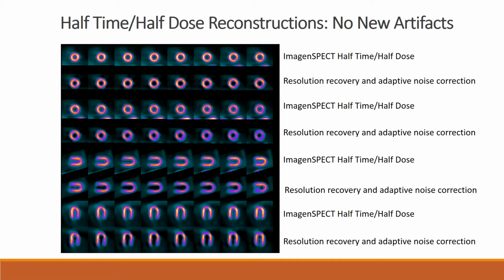There are several options available for nuclear cardiology laboratories that choose to use conventional SPECT imaging instrumentation. In this illustration, ImagenSPECT is compared with another workstation solution for performing half-time imaging in a uniform cardiac phantom. ImagenSPECT is optimized to provide the most accurate representation of the source data. This requires upfront correction of any motion artifact and accurate modeling of the noise and blur to achieve true image improvement.